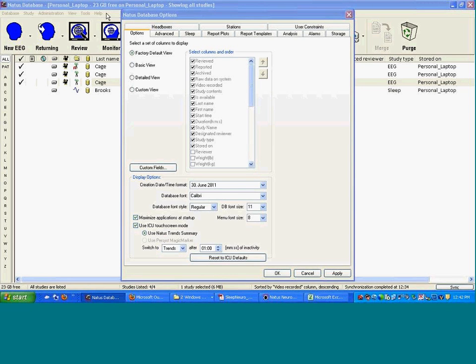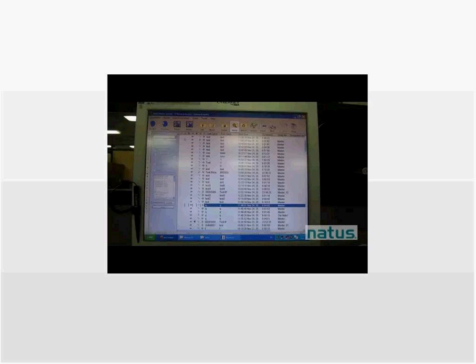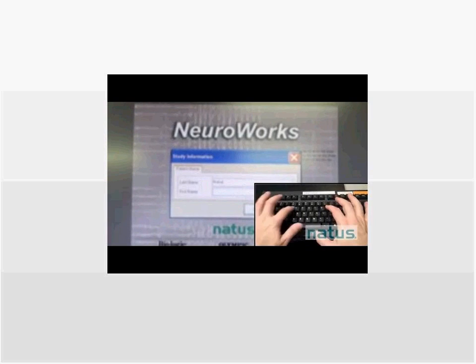I'm going to show you in this video here, just to give you an idea of what that looks like. All right, so basically, the screen, for all intents and purposes, looks the same. The only difference is you can use your fingers now to control the operations.